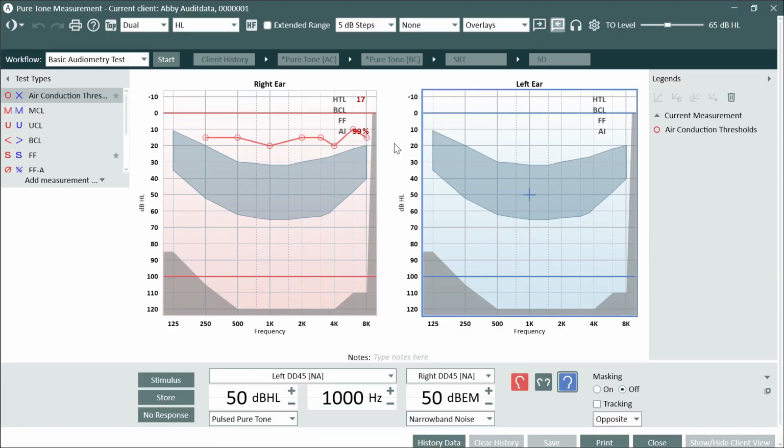This video will demonstrate the use of the masking assistant available within Measure. Using the masking assistant allows organizations to set standard masking protocols and ensure they're followed by all providers. With the masking assistant, hints can also be enabled to remind providers of appropriate masking procedures.